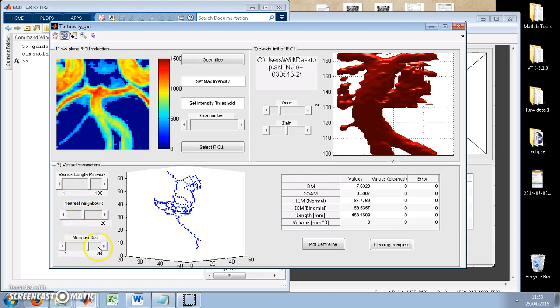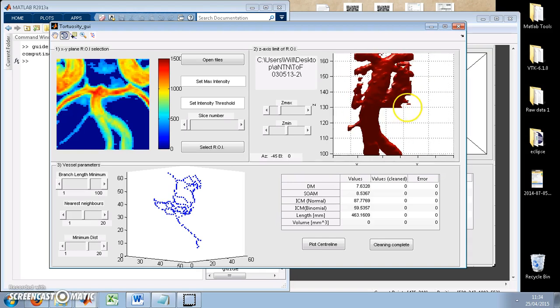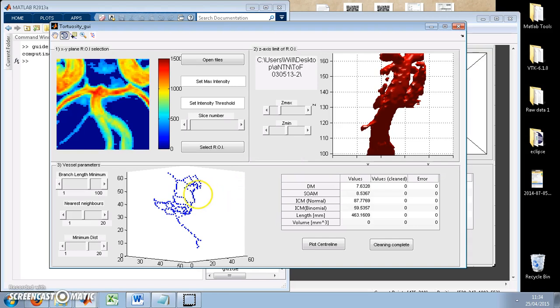As you can see, you can have a little play and see what's best, but it's not the best tool, this one really. It's only if there's lots of other external noise, whereas this one's got quite a lot of noise right next to it.